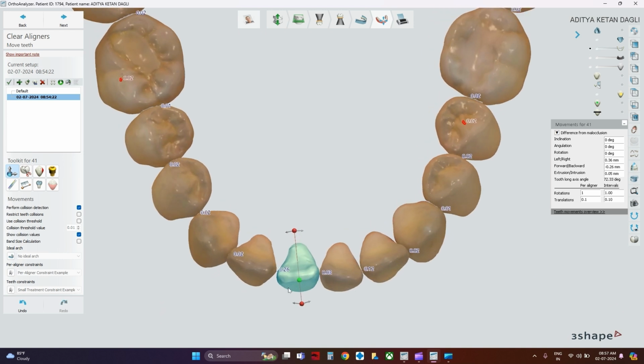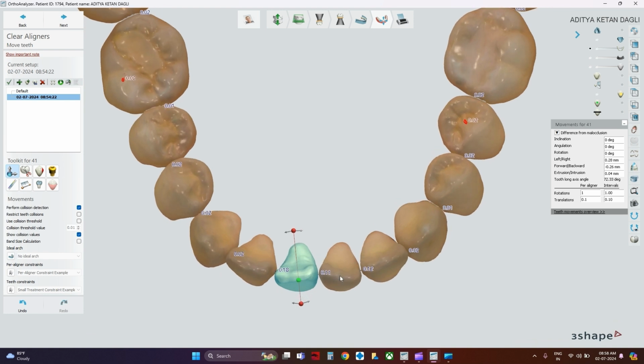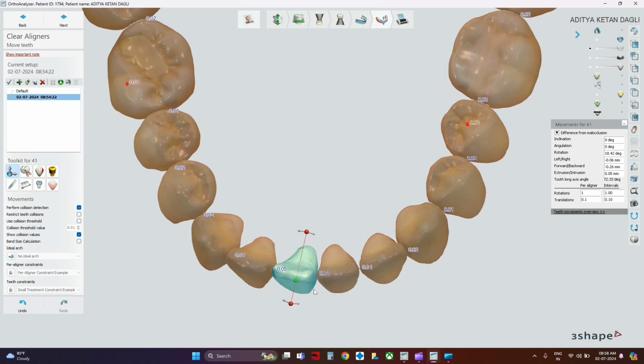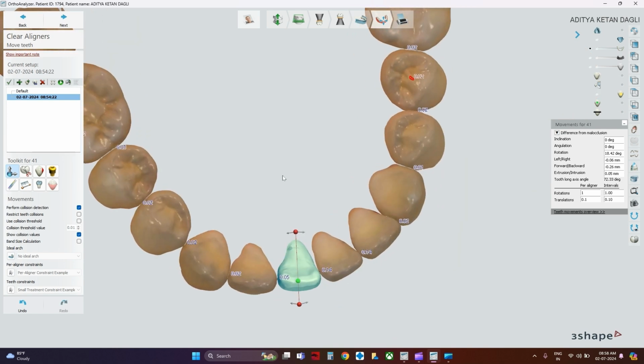One of the key elements to derotate any tooth is the lack of constraint. So as my first step, what I'm going to try is to create that space. Once I have created that space, I will derotate it to end in a position where there won't be any constraint, so the patient doesn't have to come from time to time to get those spaces corrected or to get those spaces freed.